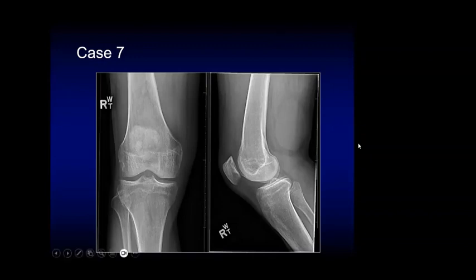Like what? يعني استاذ هو soft tissue يعني dense, homogeneous, heterogeneous. Homogeneous. Is there any calcification? There is no calcification. You have to tell. No calcification within the mass lesion. Which compartment? At the posterior aspect of the lower thigh.